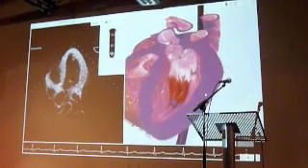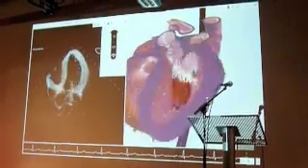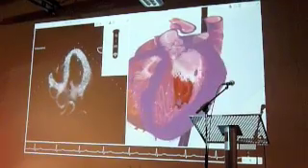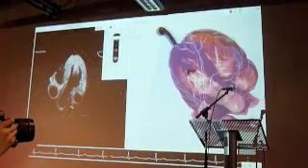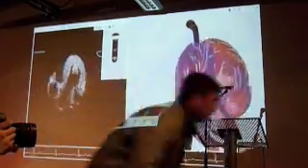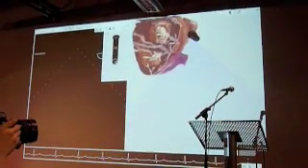So what I'm now going to do, and it's going to require me to step away from the microphone, and I apologise for those of you at the back because you're not going to really see what I'm doing here, but I'm actually just going to quickly switch to our mannequin to show you that I can manipulate the probe interactively with the mannequin. And the software can be used in various modes.